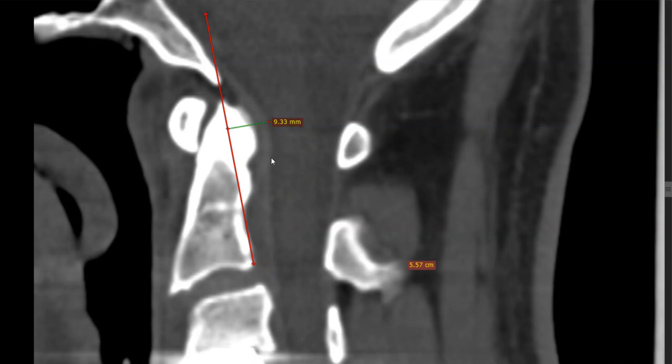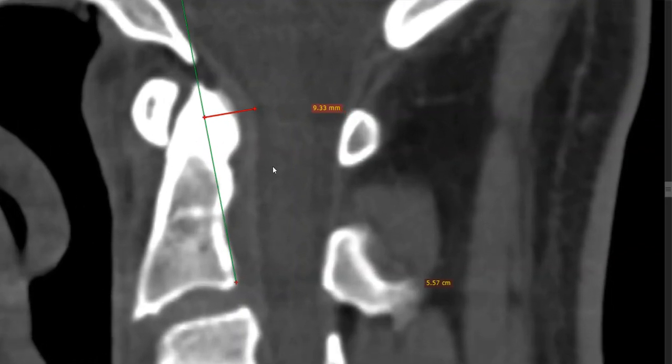So this thick tissue band here, I would have to see an MRI, so it could be, well, this could be dead on, because right here, the darker portion of this is your spinal fluid, the darker inside is your brainstem, and then white here, the lighter dark is cerebral spinal fluid. So this is the Grabb-Oakes.